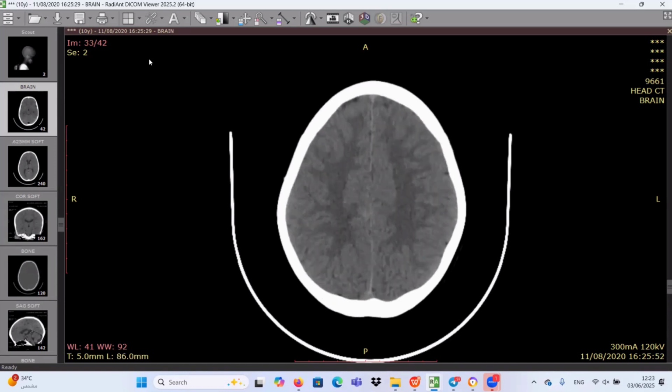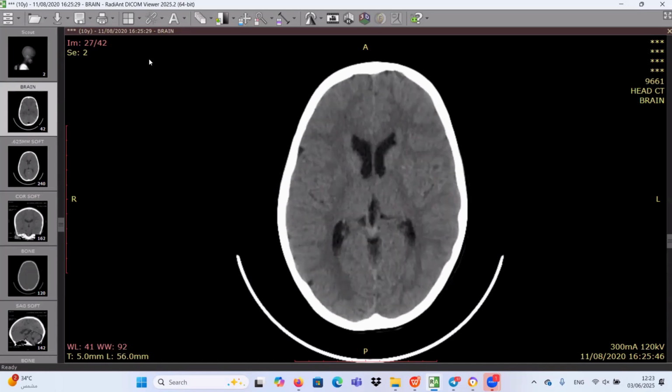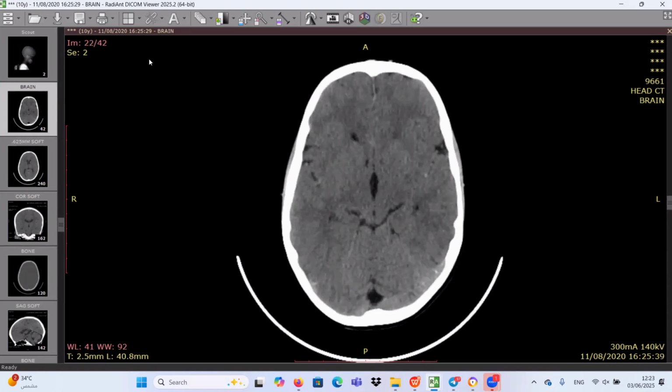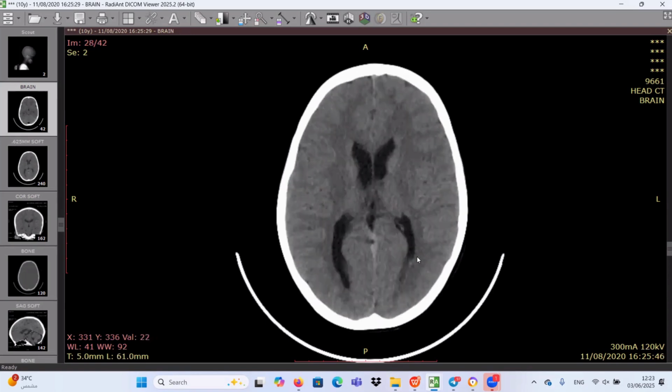Okay, so next I'm looking at the white matter and for any cortical abnormality or associated gyral malformation, because as it is a pediatric patient, I would like to consider two things. First, considering the wavy undulating ependymal lining, it could be tuberous sclerosis, which has an association with cortical and subcortical tubers. To rule them out, I need to see any calcific foci. There are some calcifications seen in the left transverse sinus region, but that usually doesn't have any association. It's away from the abnormality, yes.